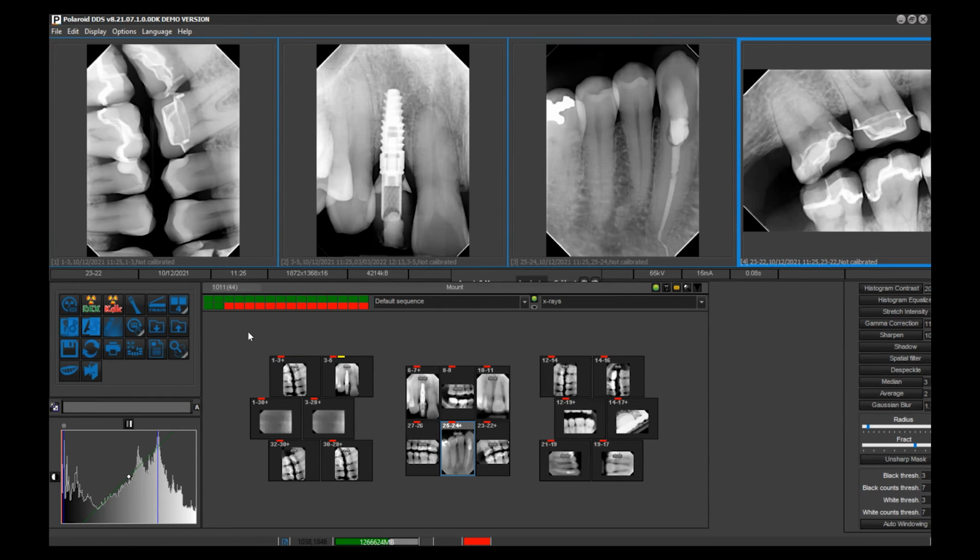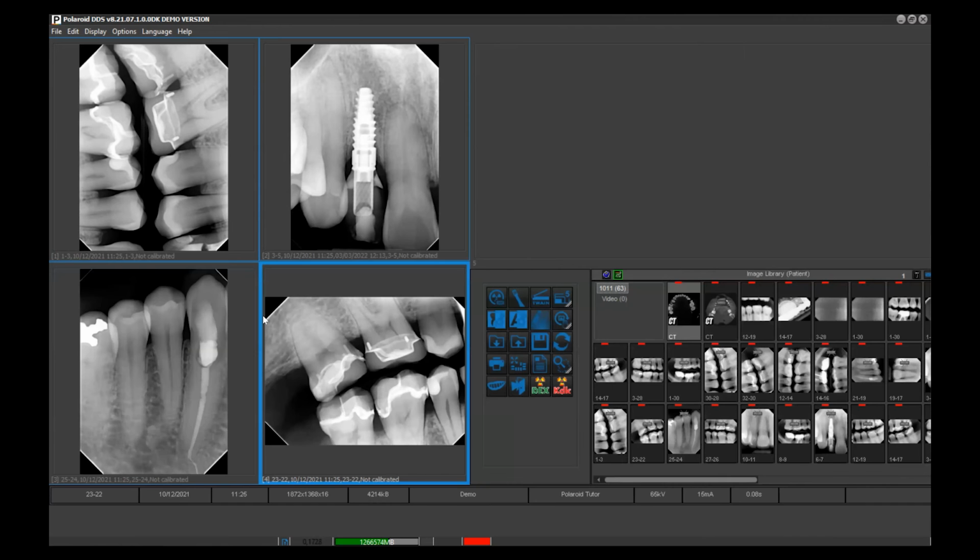And if you want, you could grab 4 of those, put them up on the screen, and see all 4 and see a progression between the 4 images. Exactly. Beautiful. That would be nice. Yeah. And again, I like the 4, but you can use up to. You can have 1 big image. You can have 4. You can have 5. You can have 4 with a pan.